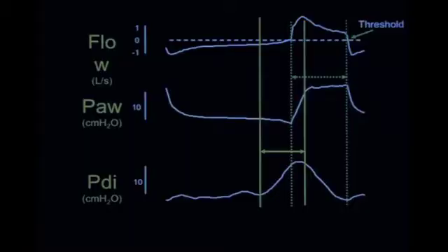There is, beside the unavoidable delay to do the inspiratory and expiratory trigger, the synchrony is pretty good. However, same ventilator, so not a different machine, a different patient.